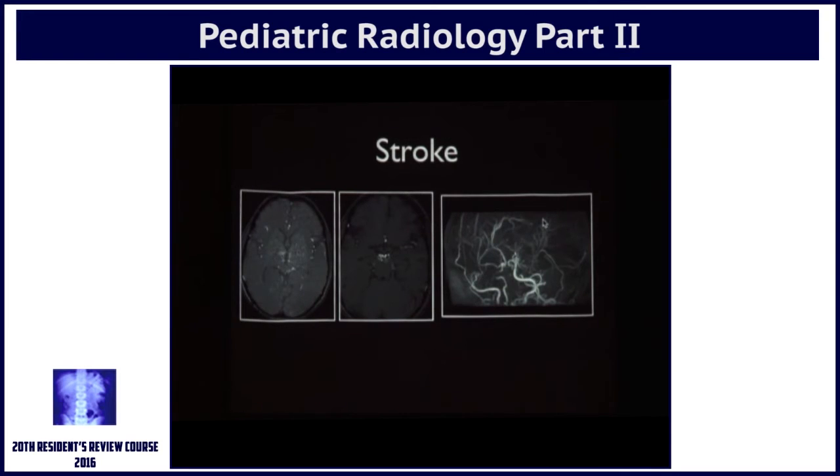Okay, now coming to pediatric stroke. Yeah, so this is one of those classic spotter diagnosis, multiple collaterals in the thalamo-perforating arteries, and then the main ICAs are blocked, and that's why you have the collaterals, and the collaterals give the puff of smoke appearance.